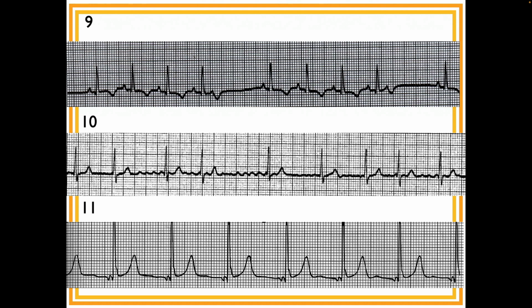This kind of looks like, is it atrial fibrillation? Yes, it is. A-fib. You can stop right there. Okay. That's all I got for that. Okay, who's next? Number 11.